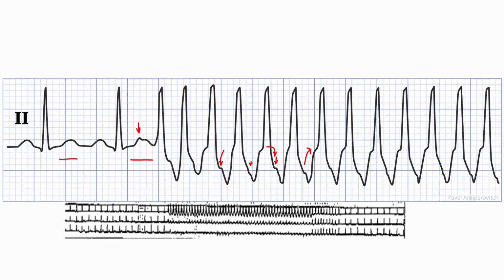In case reports it does, but for the most part, if you see a wide complex tachycardia initiating with an A or with a PAC, it'll almost certainly be an SVT with some sort of a bundle branch block. Okay, and so this led me down the SVT diagnosis. The P waves themselves aren't terribly helpful.